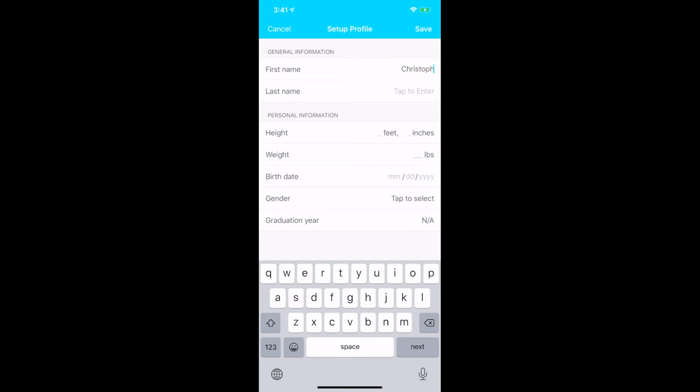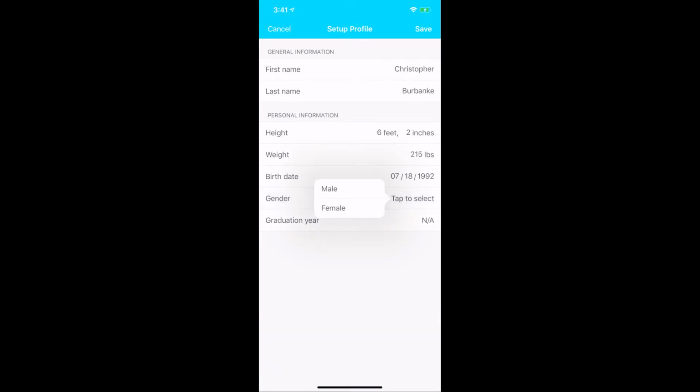Once they select Have a Session Code, they'll enter the 5-digit session code you give them and be prompted to enter their demographic information. If the name and date of birth match an existing profile within your organization, the data from the new baseline test you're about to administer will be added to the existing profile. If not, a new profile will be created.